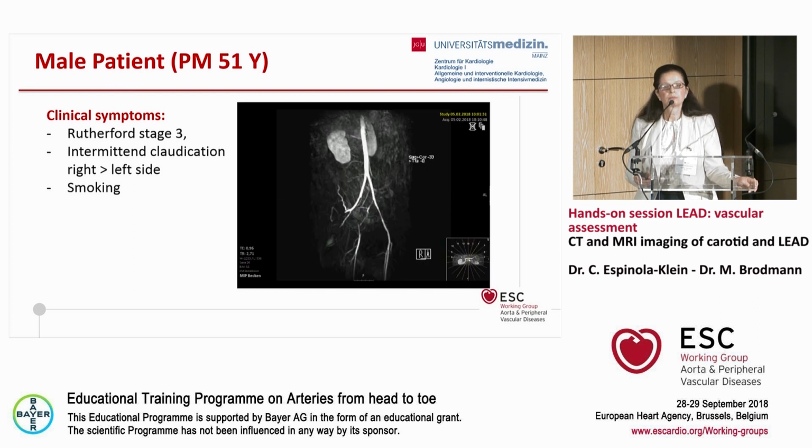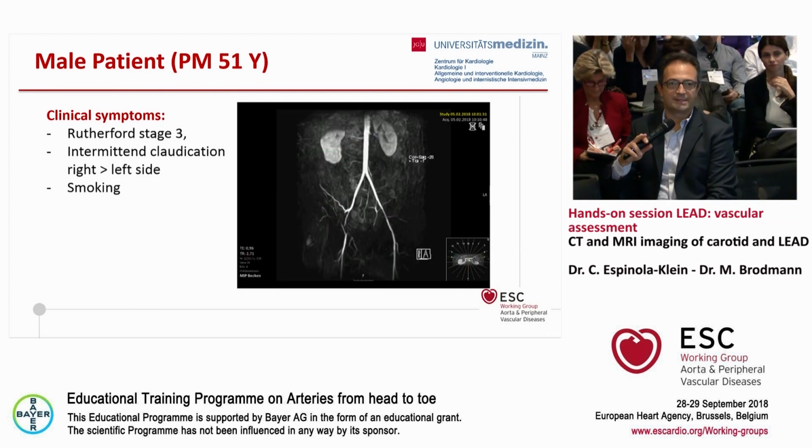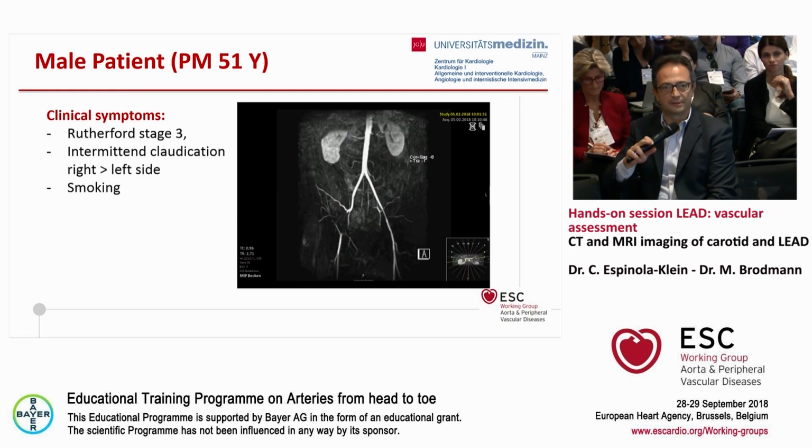Just a brief comment. I fully agree with you that going from the contralateral femoral would be very risky in terms of re-entering the true lumen before the origin of the common femoral, because you see there is the epigastric artery there.